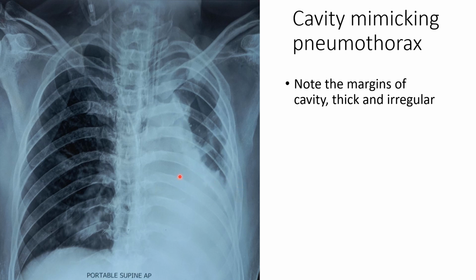And the other thing is, if it had been a pneumothorax, the trachea and mediastinum should have been shifted to the opposite side. But here, if you see the mediastinum, this lung margin is up till the spinal area. So the heart shadow, which is supposed to be somewhere here, has shifted towards this side. So there is some sort of a volume reduction that usually happens only in fibrocavity situations, and the trachea is not very visible.